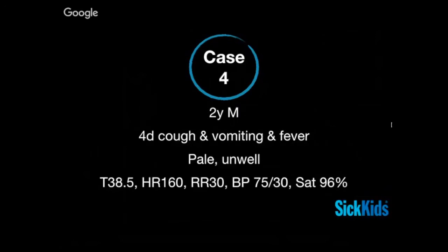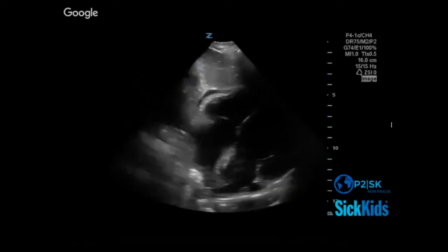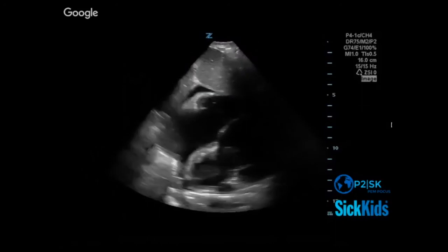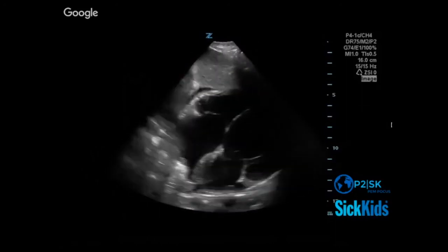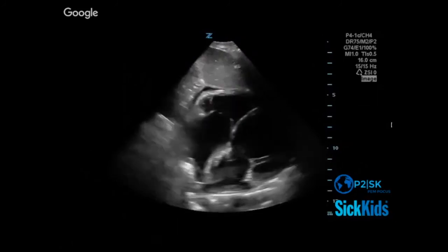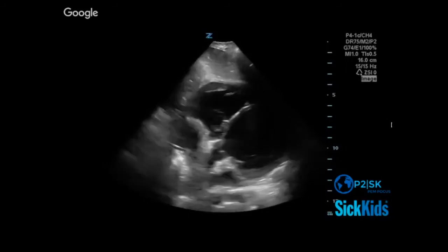Okay, next case. Back to the same kid. 2-year-old. This time he has not traveled here from Colombia. This time there's fever again. They're febrile in the ER, and they have that same vital pattern that I keep putting up. So, team, what view, what findings? Subxiphoid, perfect. A little bit of fluid I'm hearing, yep.